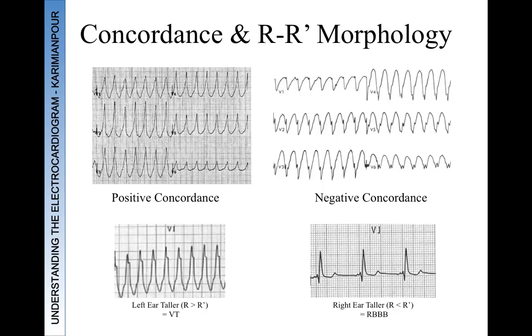There's aberrancy conducting the electrical current down to the ventricle. So irregular wide complex tachycardia, think about atrial fibrillation with either a left bundle, right bundle, or aberrant conduction through the myocardium. And that's because monomorphic ventricular tachycardias are often regular, most times, if not always.